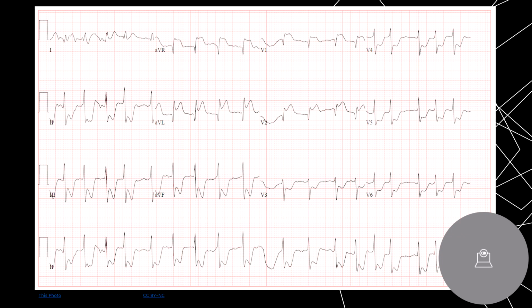Let's move on. Oh, here's a good one. Let's break this apart. Okay, so again, we'll go V1, V2, septal first. V1's actually, again, pretty hard to break apart. But if you look at what's going on in 2, V1 kind of makes more sense. So here's your QRS, right? So in case you didn't know, there has to be a T wave. You're never going to come across a lead that doesn't have a T wave because repolarization processes take time. There's always a T wave.